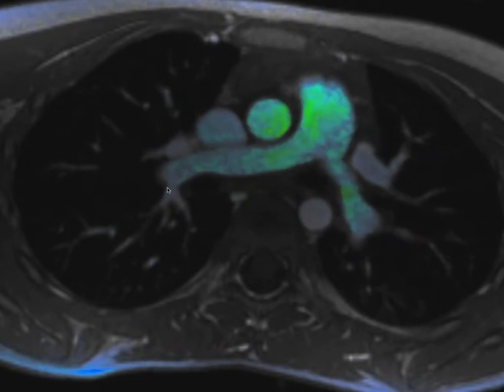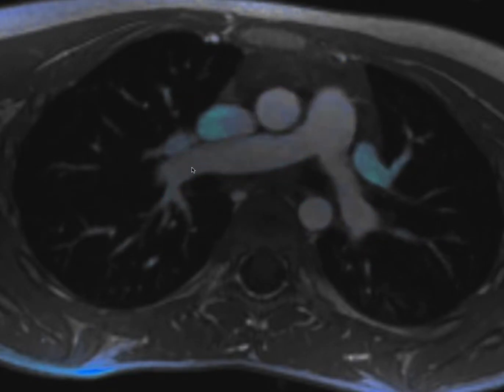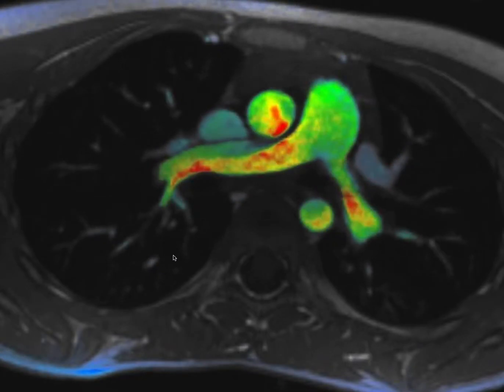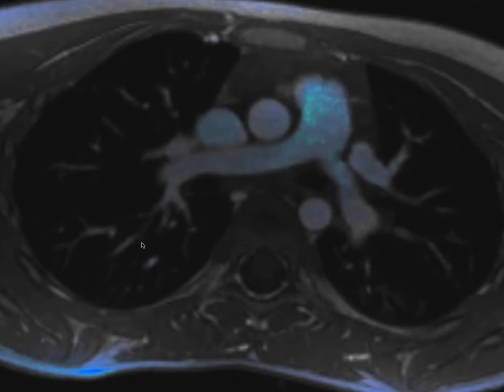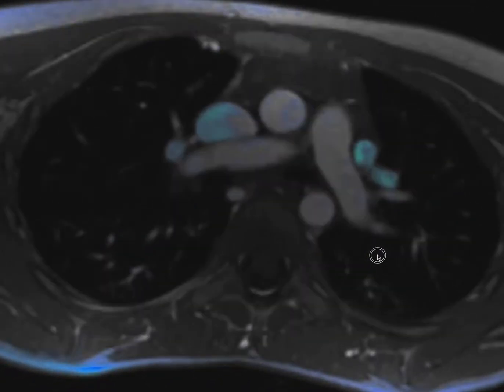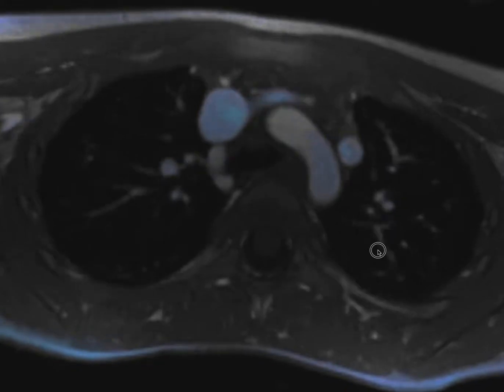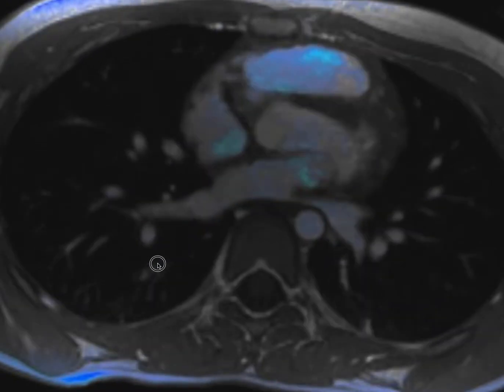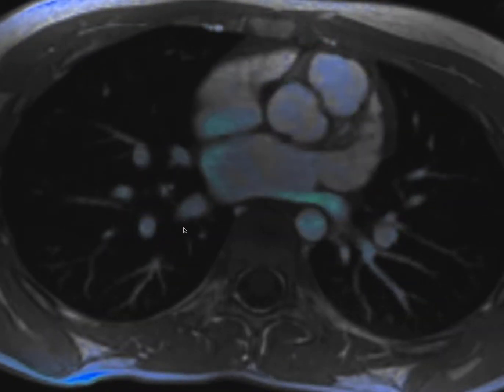Here the blood gets oxygenated as it branches out from these pulmonary arteries, all the way out from the right and left pulmonary artery to the lobar level. Say here, this is towards the upper lobe, and then to the segmental level, all the way to the capillary level. And then we have veins that drain the lungs. These are the pulmonary veins. For instance here, I'm going to draw your attention to one of the veins that may be the most easy to follow as it's coming back to the heart. So for instance here, see a vein.